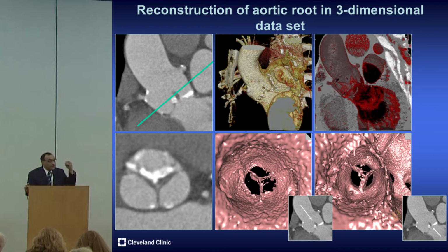But what we are using is precise reconstructions, like the panel on the bottom left, where you can have a precise look at the aortic root and do precise measurements. No other technique offers you this level of precision in a reproducible manner, where your CT from today versus last year versus the year before, you can serially monitor for growth.